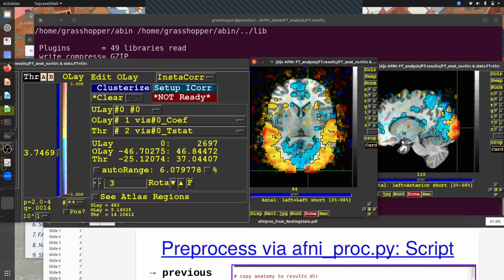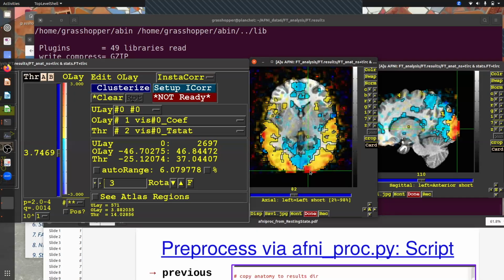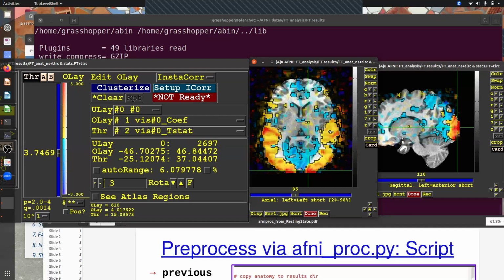So now we can look at our statistical results for a sanity check. What did we do? We had an audio-visual task. So what would we like to see? We'd like to see audio and visual parts of the brain with strong responses and strong statistics. Depending on whether you know brain biology or fMRI, that's what this map looks like to me, because when I'm in the visual cortex here, I see this red, which is now set to be 3%, and I know that's about the most I can expect. Yeah, that looks reasonable. And there is an audio component. It's actually a mixed audio-visual task. So even during the visual, seeing something in the auditory areas also makes sense.